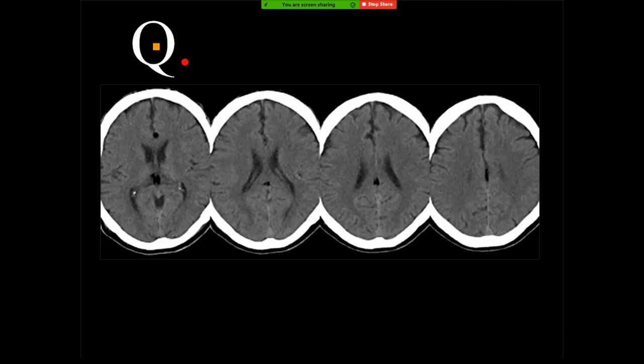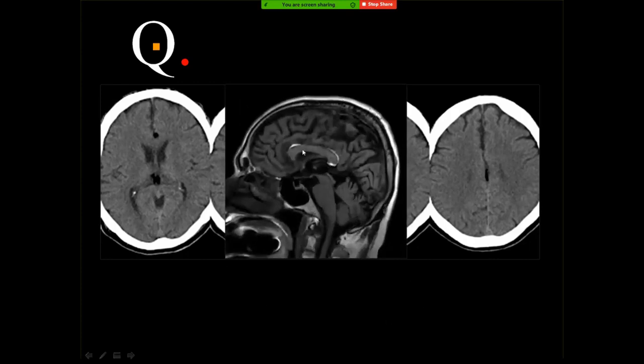No, it's effacement of the white matter. I think rupture of the dermoid cyst? In the third ventricle, this is fat. Yes, fat, you are right. This is fat, there is no dermoid cyst. And this is the anatomic location of the corpus callosum. Then this is lipoma of the corpus callosum.